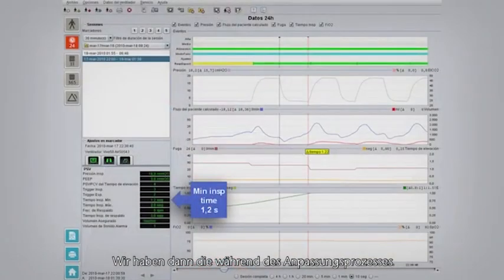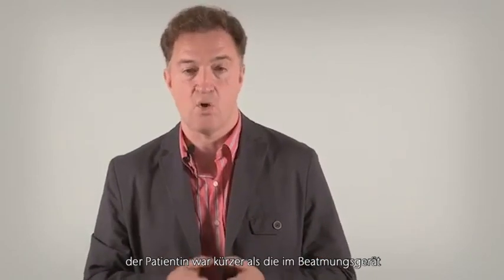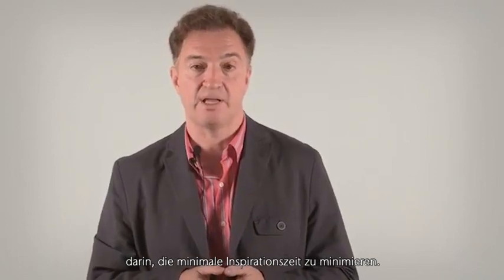Then we downloaded the information available during the adaptation process, and this is a sample from this patient. You can see here in the flow time curve that it reaches negative values at mid-inspiration, indicating that the expiratory phase of the patient was initiated whereas the ventilator remained in inspiration. In other words, the neural inspiratory time of the patient was shorter than the inspiratory time programmed in the ventilator, and we were causing, for that reason, delayed cycles. In this particular case, the problem was solved by suppressing the minimal inspiratory time.